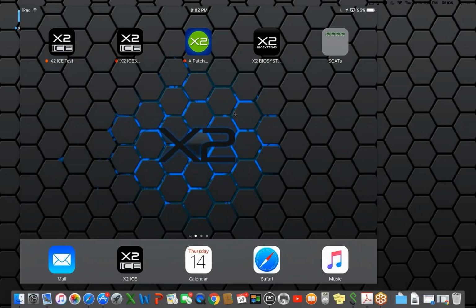Welcome to the X2 Biosystems Integrated Concussion Evaluation 3 training. Today we'll be discussing many key features of the application. To launch the application, find the application on your home screen.